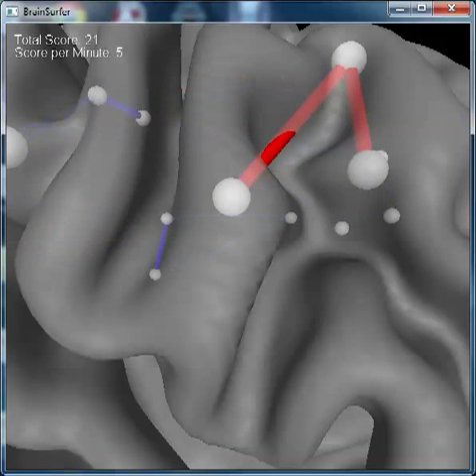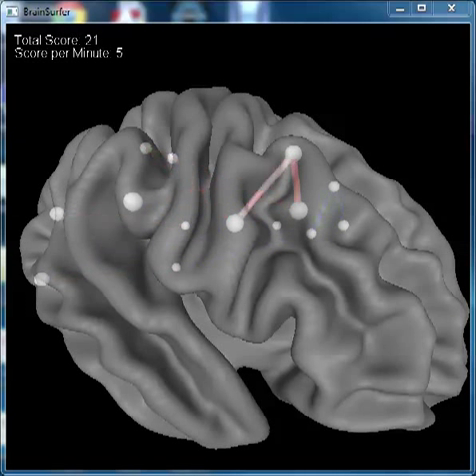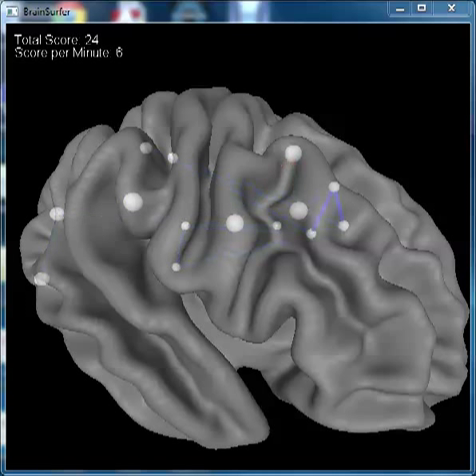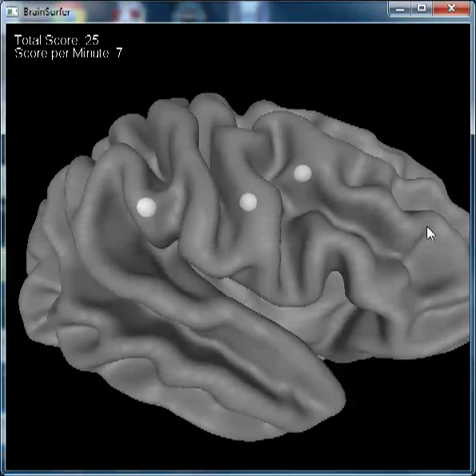But to do that, we need to isolate them and just focus on those nodes that are most significant and deviant and most related to the patient's symptoms. We'll do this by selecting specifically Brodmann area 8 and Brodmann area 9 on the right side and Brodmann area 40. So we'll just isolate everything to these three nodes and the connections between the nodes, so that simplifies things.